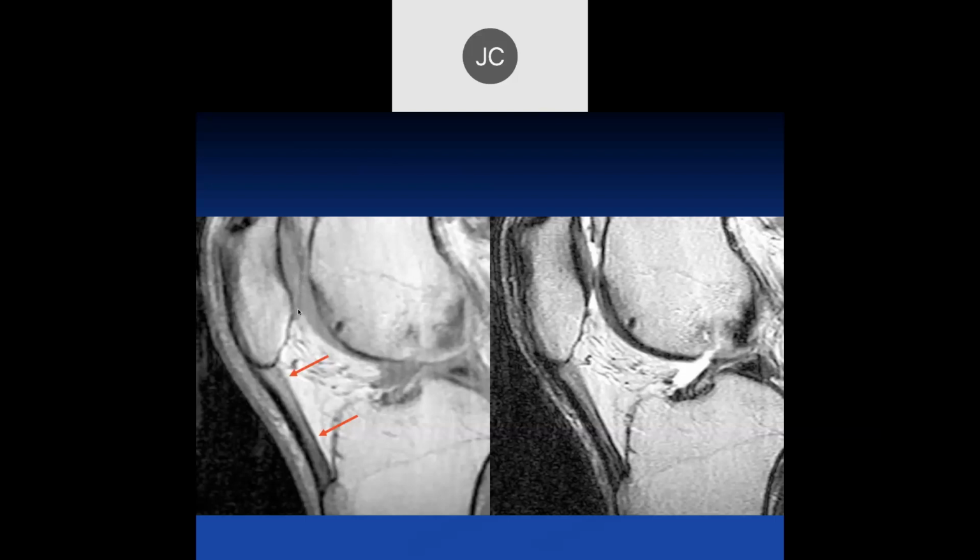What's the problem here is that you've got a large inferior pole of the patella. If you didn't have a large inferior pole, then the patellar tendon would be longer. It would insert about here. But with a prominent inferior pole, you have a much more rigid area, which is the patella itself. It looks like the patellar tendon is short, but the total distance between the tibial tubercle and the inferior aspect of the articular cartilage is really pretty normal.